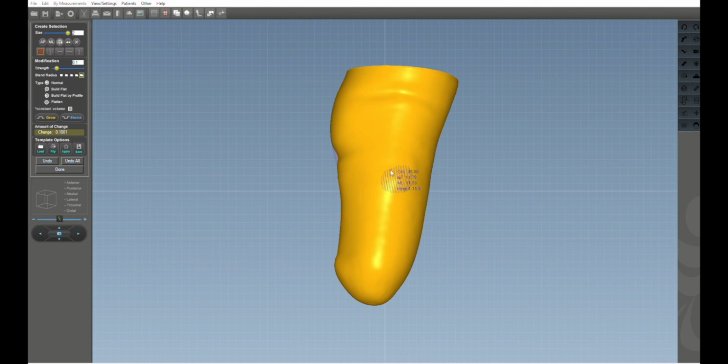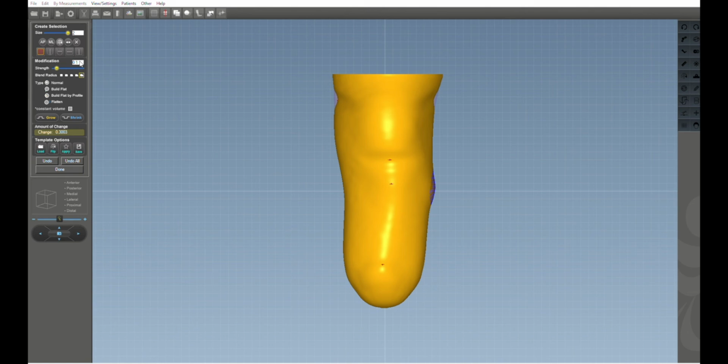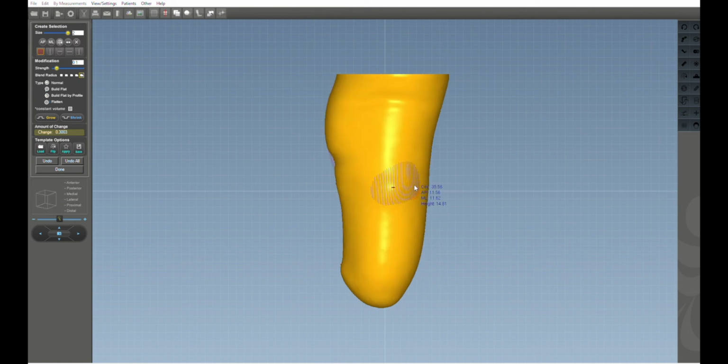It's not uniform, so I don't want to apply uniform modification. I also want to allow for the tracking of the head of fib. Okay, right now I have 2mm on there, and I think I want it just a little larger, just in case, once again, if he drops in, I just want the relief to be sufficient.